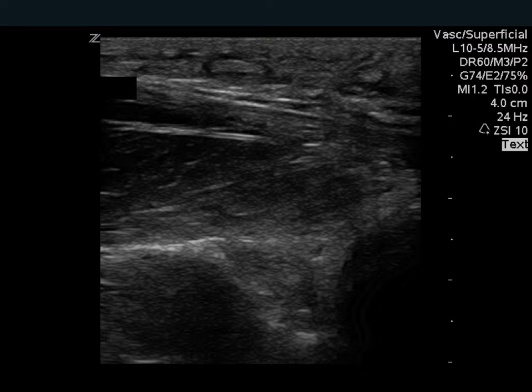Do you recall the case from the beginning of the presentation where we were questioning if there would be an underlying septic joint or not? Whether the fluid in a joint is due to infection, fracture, or inflammation, it should still displace the posterior fat pad. In this case, this was the ultrasound of the distal humerus. Do you think there is a joint effusion in this elbow? No, probably not. The posterior fat pad is well seated in the olecranon fossa.